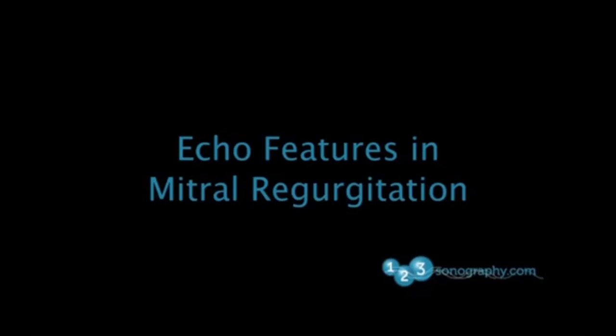But there are also other indirect signs of regurgitation. We'll take a look at those in the following demo. So let's see which additional features a patient with severe mitral regurgitation has.